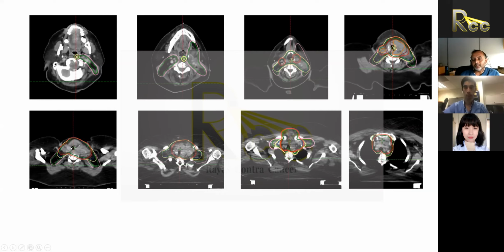And the other thing that I want you to get a sense of is that her airway is patent right here, right? So this is 1 week after her surgery, after her CT simulation, where she got simulated and started within a couple of days. And you can see that the airway is patent. And you can now see the volumes down here. So now we're coming in that central compartment.